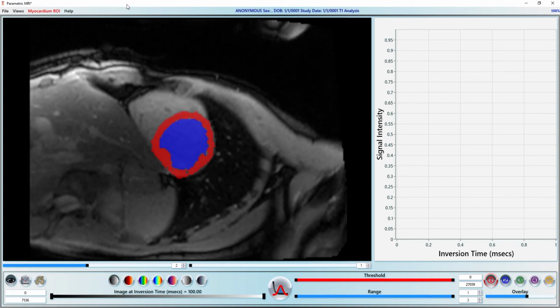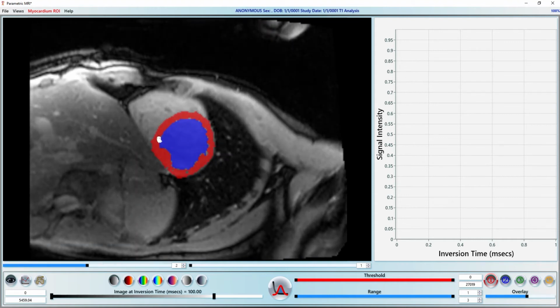Hello. In this video, I will go over how to manage analysis results in pMRI. This includes saving, loading, and batch processing regions of interest, numerical results, and curves. Let's get started by analyzing a case.